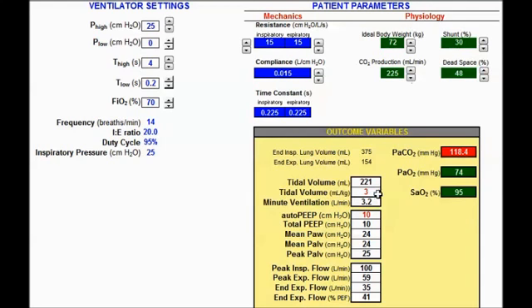It's smaller than the 4 to 6 cc range for lung protective strategies. However, it's creating quite a bit of auto PEEP, as you can see, about 10 centimeters water auto PEEP. I'm going to increase this to, let's say, 0.3. As you notice, my tidal volume is a little higher at 4 cc's per kilogram. Still my safe range. My auto PEEP is less.